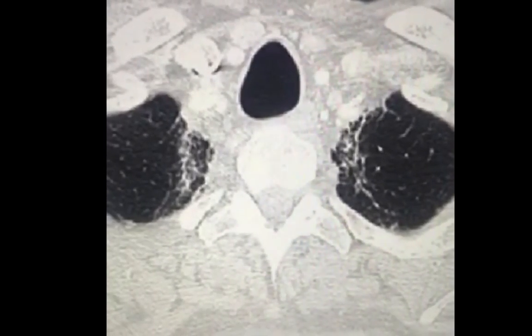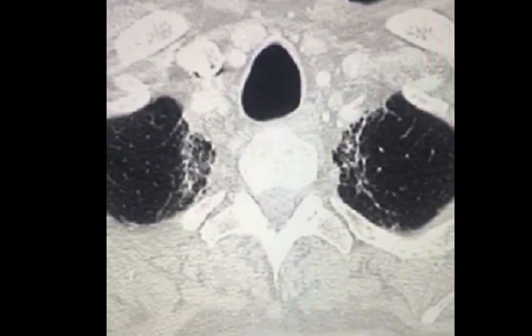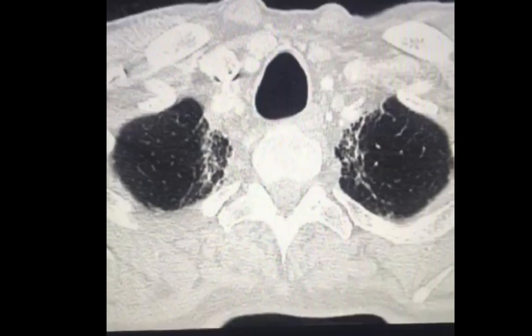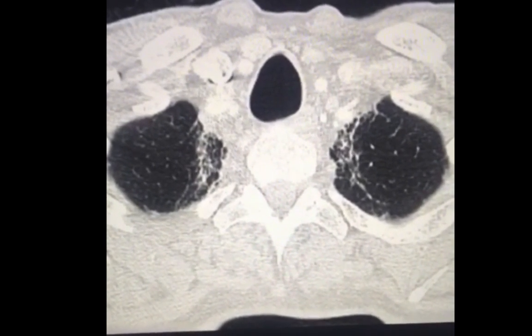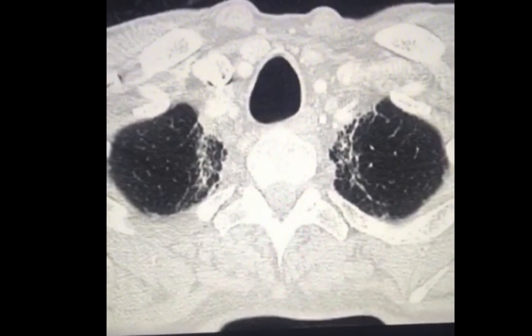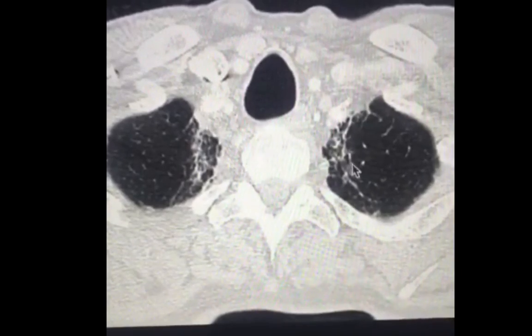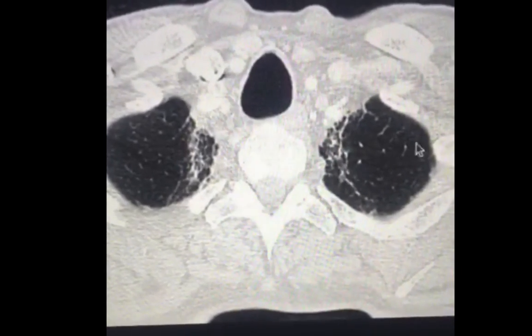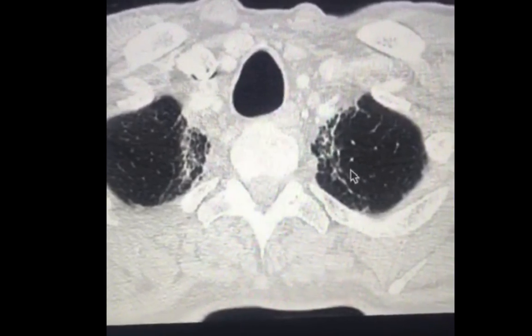The medial aspect of both lung apices demonstrate areas of reticulation and architectural distortion consistent with fibrosis. However, the distribution of the fibrosis is unusual since it involves both sides of the lungs, mainly medially and sparing the lateral aspects. What's unique about this appearance is that there is a clear demarcation between what's fibrotic and what's not fibrotic, almost a clear-cut line that separates both areas.